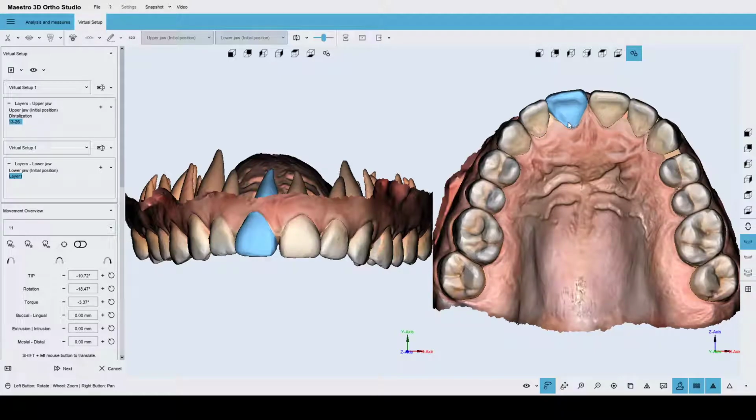So, for example, in this moment I am interacting with the right side of the screen, performing some movement. If I want, I can refine this kind of movement now, interacting in the left side of the screen.